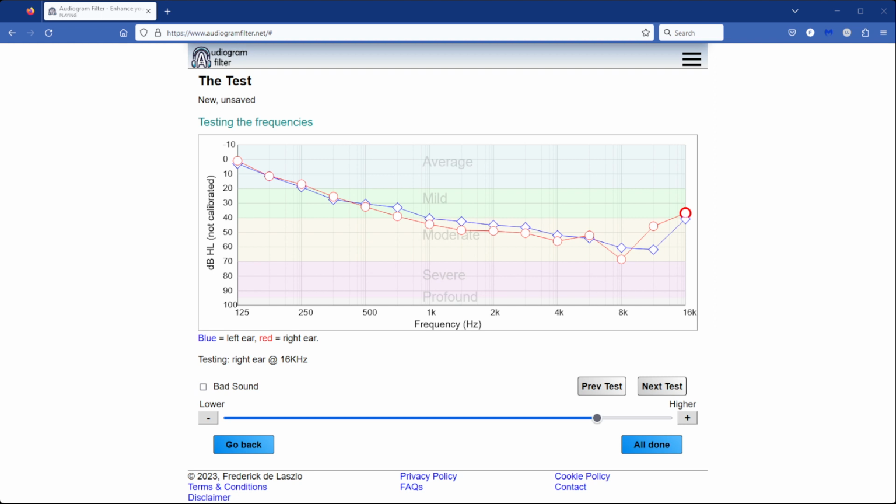Okay, so I've just turned up the desktop audio so you can breathe a sigh of relief. I'm sure if you have average hearing, you probably heard all of the tones as it went through. This is my profile at that level. As you can see at this level, lower frequencies I'm okay, gradually mild to moderate, and touching on severe. If I chose a lower volume, this would probably approach the severe.